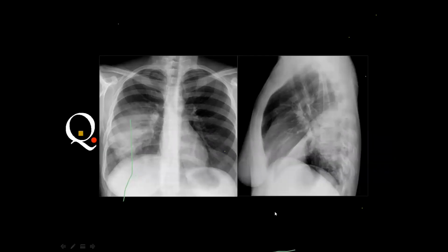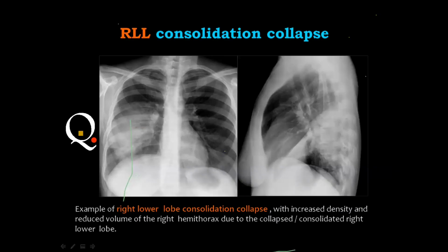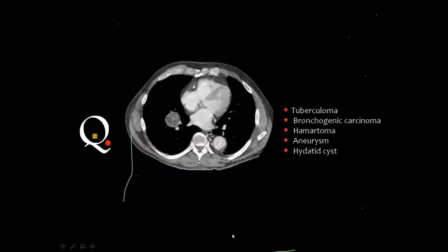The answer for this is right lower lobe consolidation, and this is the right answer. You got a patchy opacity with internal air bronchogram, meaning that is consolidation. Then if you look in the lateral view, you see the opacity is posterior, and I said that the only posterior lobe on both lungs is the lower lobe. The lower lobe on the left and the lower lobe on the right lie on the spine.